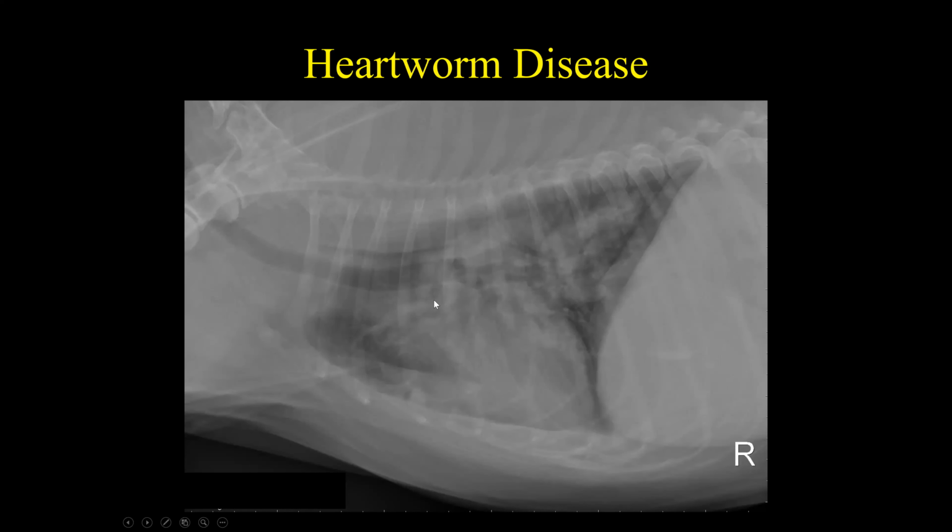But in this particular case, this artery right up in here looks like it may be a little bit larger in diameter than the vein. We know they should be the same size. Also, typically when these vessels come out from the tracheobronchial region and go out to the periphery of the lung, they should have a nice straight course. They should go straight out. They shouldn't wind around.